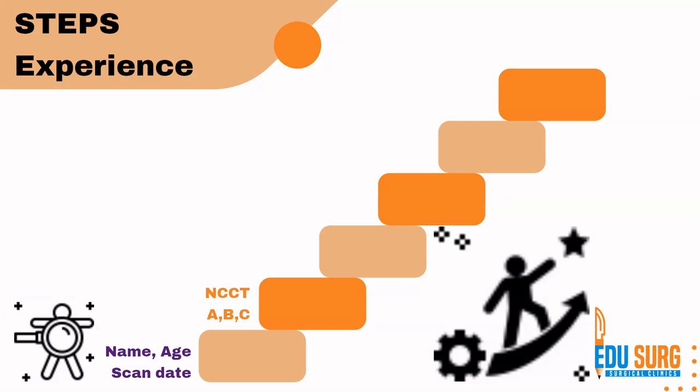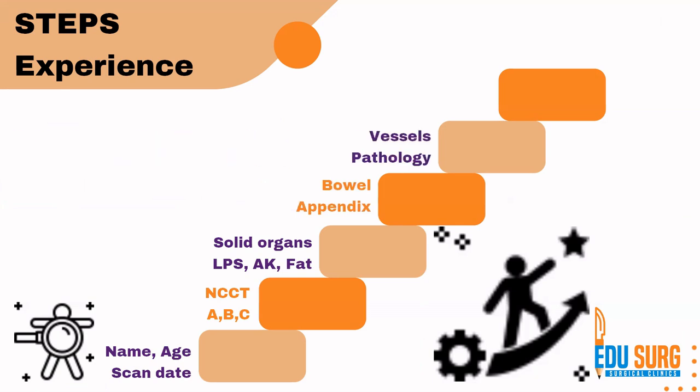Once you have seen that, go for the NCCT plates and see ABC, that is the air, blood, bowel, and collections, calcifications. These things you can appreciate well in NCCT. Once you have seen that, what we prefer is looking at the solid organs: liver, pancreas, spleen, adrenal, kidneys, and the fat. Once you have seen the solid organs, look at the bowel and appendix. From esophagus to rectum or rectum to esophagus, based on your preference, you can trace the bowel. We have a video on how to trace colon. If you want, you can have a look.